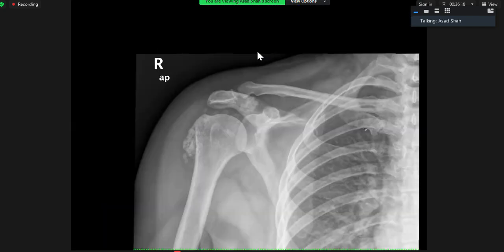So I've been presented with a frontal projection of the right shoulder joint of a patient who has bilateral shoulder pains, where I can see areas of calcific density present intra-articularly, causing slight extension over the upper proximal part of the humerus.